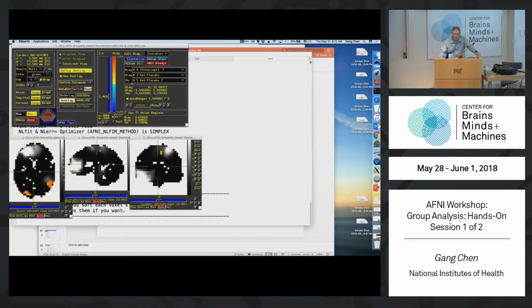Now the blue, those negatives, are gone, hidden, and the p-value changed. The p-value is suddenly divided by 2. That's because before it was two-tailed, which means the areas of the two tails add up. Now I just focus on the positive, the right-hand side, there's a positive one. So that's why the p-value is divided by 2 now.